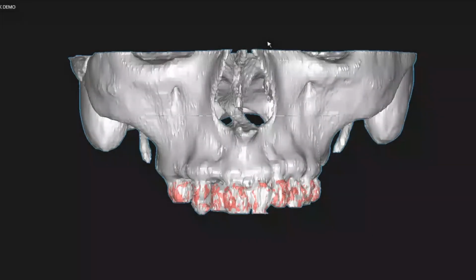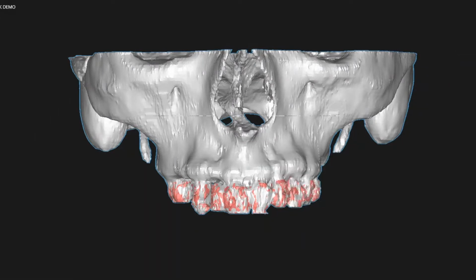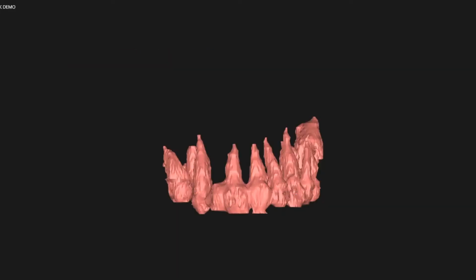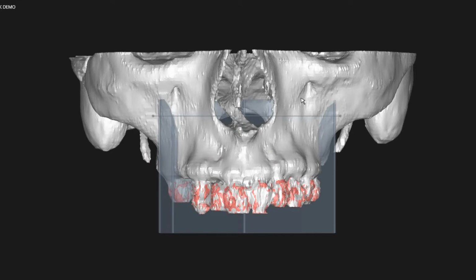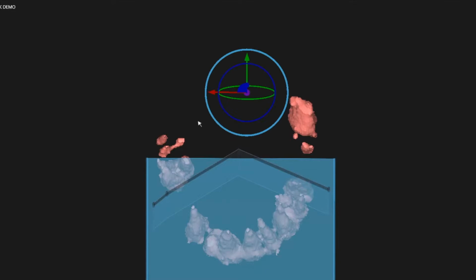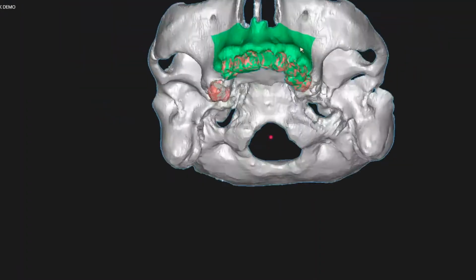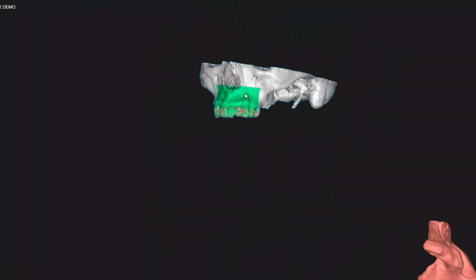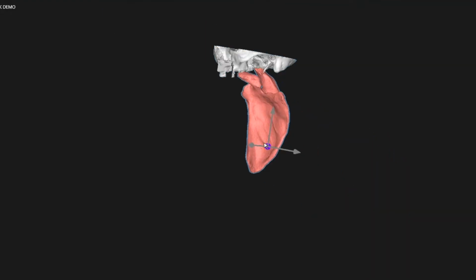And which scapula did you want to use for this one? So usually, now we're doing a midline lesion, it doesn't matter as much, but usually we go for the contralateral to get increased pedicle length. But you can go for whatever scapula. Okay, go for the right. So here's the right scapula.